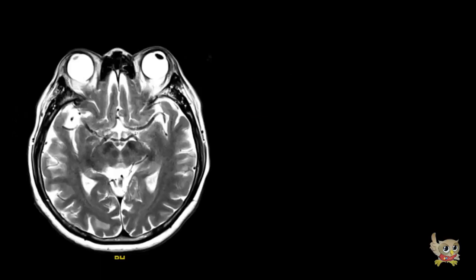This is at the level of the midbrain. The midbrain looks like an inverted shorts. The substantia nigra delineates the tegmentum from the cerebral peduncle. The cerebral peduncle serves as a conduit of different projection fibers, and one of them is the corticospinal tract. At the tegmentum, you may see the red nucleus, which is involved in motor coordination.